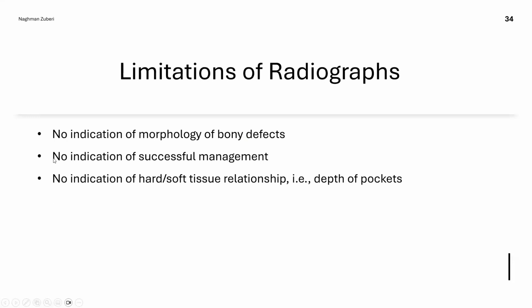Limitations of the radiographs: no indication of morphology of bony defects, no indication of successful management, no indication of hard-soft tissue relationship, that is, depth of the pockets.